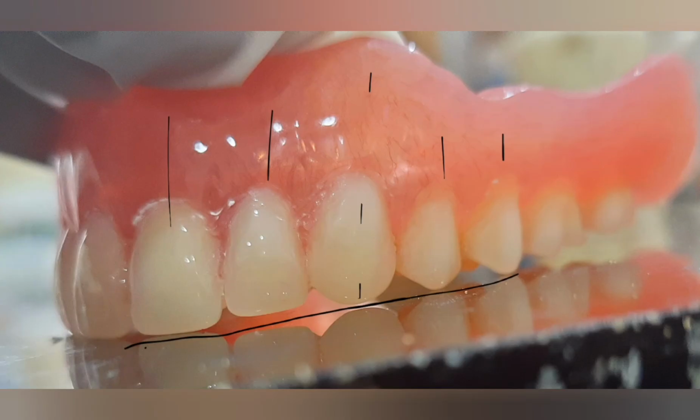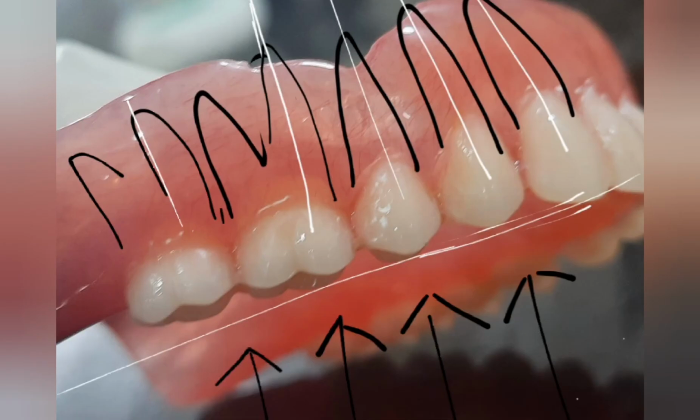In the posterior plane, the buccal cusp of the first premolar should contact the straight plane or the glass plate, while the palatal cusp will remain above the glass plate. For the second premolar, both the buccal and the palatal cusp have to remain in contact with the straight plane or flat plane or the glass plate used for the purpose. The mesiopalatal cusp of the first molar should remain in contact with the flat plane, while the distopalatal cusp has to rise above 0.5 to 1 mm. From the buccal aspect, one should be able to view both the mesiopalatal and distopalatal cusps.